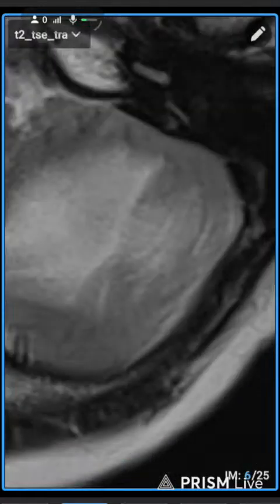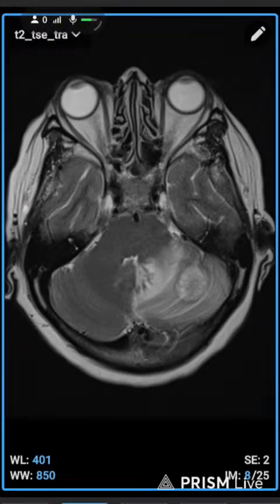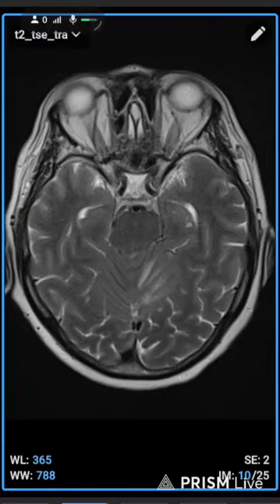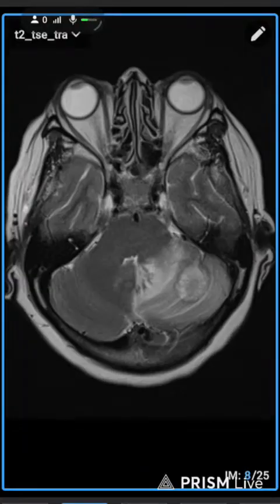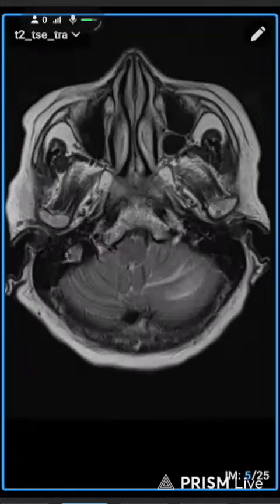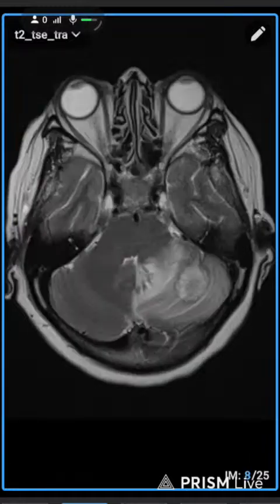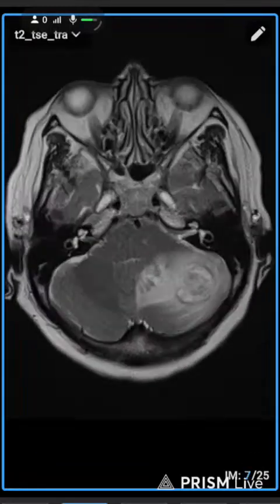There is a proper outline of tissue. For the history of the patient: she had a CVA maybe 4 to 5 years ago. Recently she has been suffering from headache and dizziness, and hypertension or diabetes was unexpectedly recognized, about a month ago.